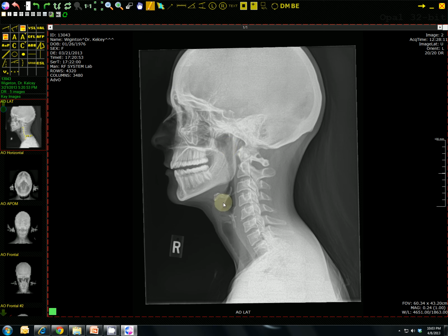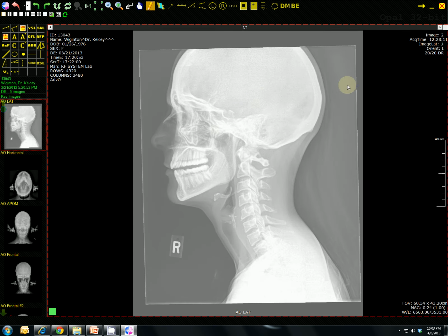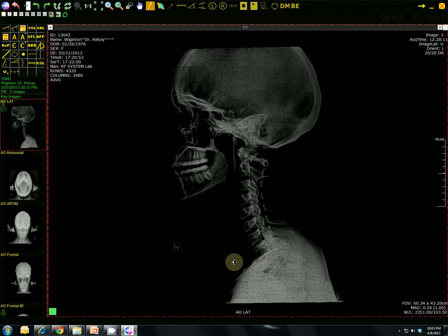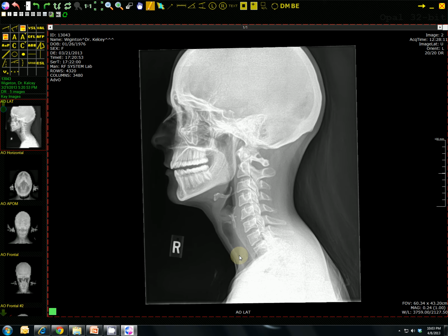Oh, okay, one thing. Going back to the right click, let's say I get way out here and I just don't know how to get back to where I can see something clearly. At that point, I press Control and 0, and that zeroes me back to the default. And that's very useful because sometimes you just cannot see things and you're not quite sure how to get back to that 0 point, and that resets it.